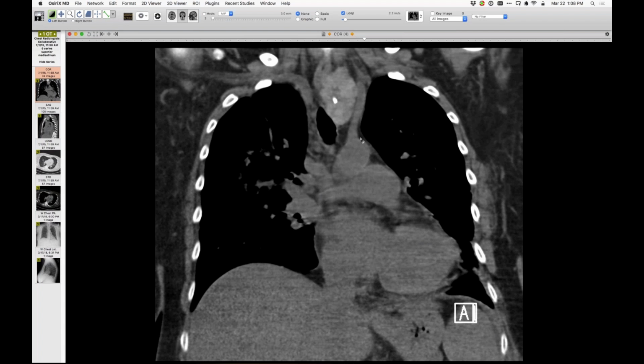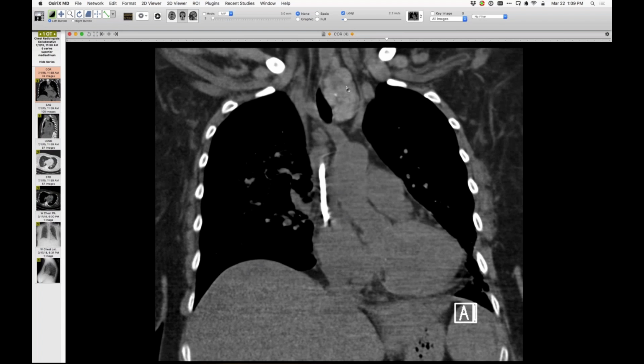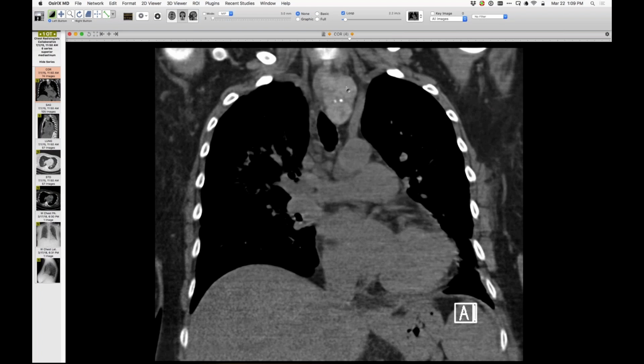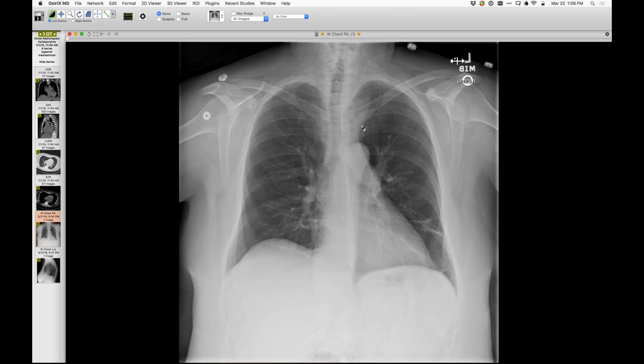It so happens that the interface is actually produced by the left subclavian artery, which is expected, but it is displaced a little bit left lateralward. So that's the interface we see there. But the lesion is the usual lesion, which is a paratracheal goiter that extends, in this case, into the left superior mediastinum. So just a really nice cervicothoracic sign in relation to that.